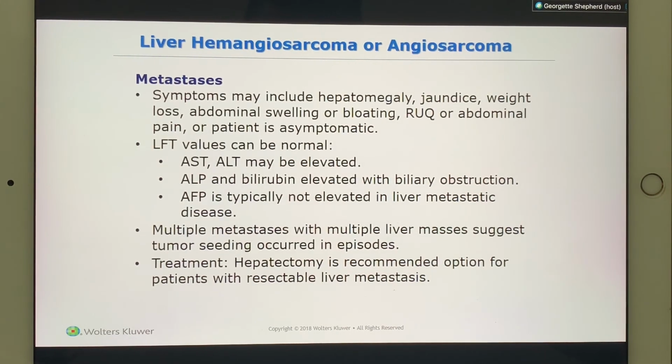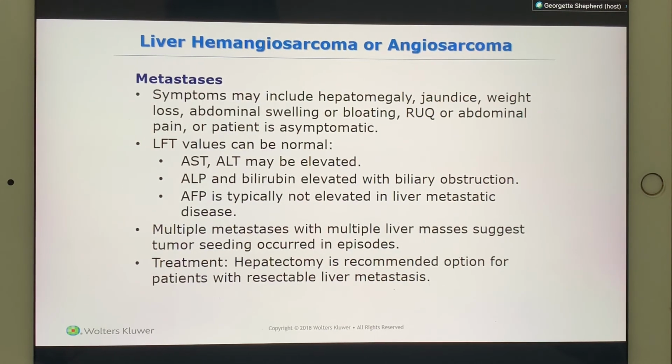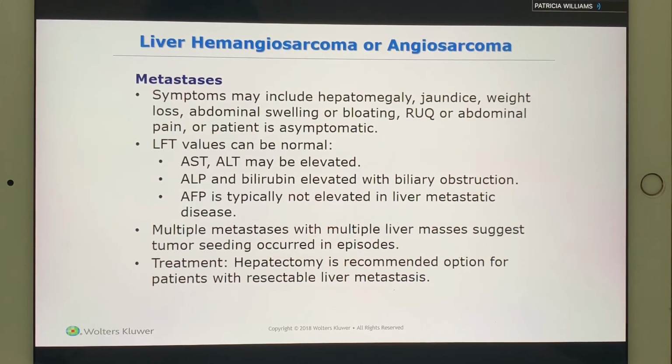So almost all of the disease processes that we've talked about have almost the same appearance. Now we learned today that a lipoma causes the speed artifact. It's the only one. An adenoma has a halo around it. A focal nodular hyperplasia and a hemangioma look almost exactly the same.